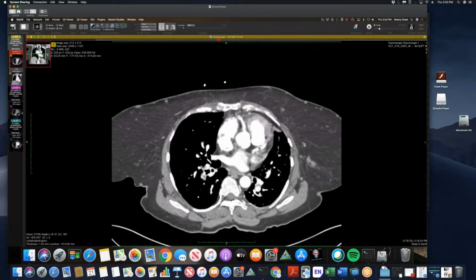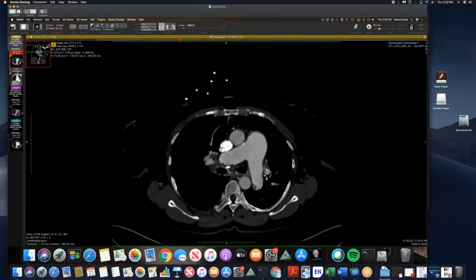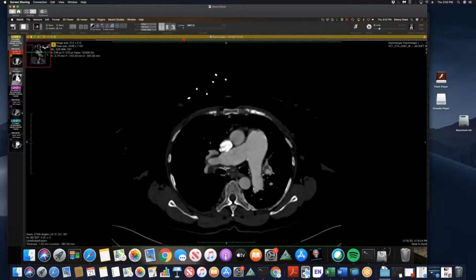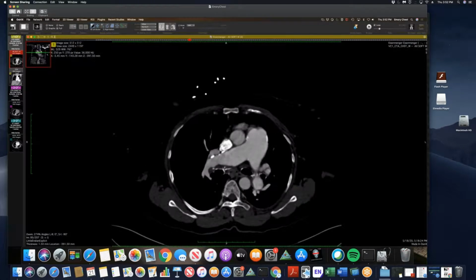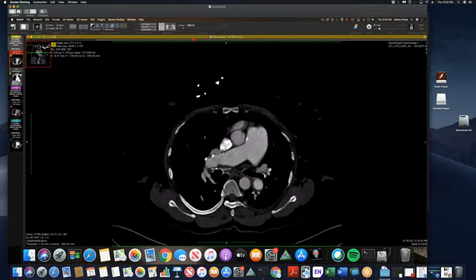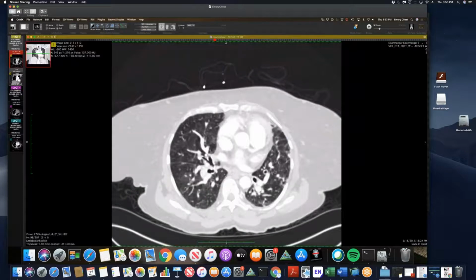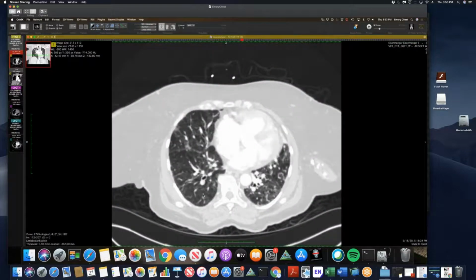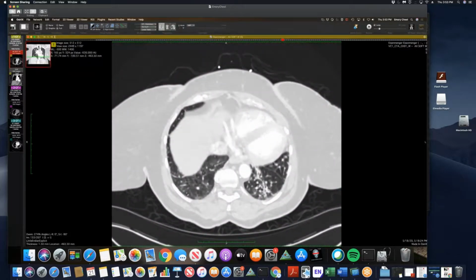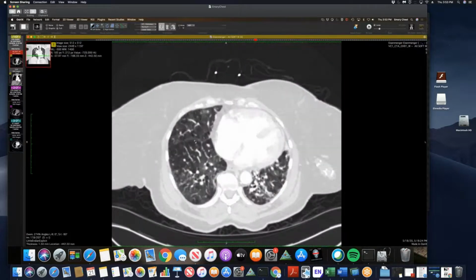If we go to the PA, she has filling defects. You can see atherosclerotic disease along the intima of the PA. This is in situ thrombus, most likely, which is commonly seen with Eisenmenger's. And if we go a little bit more peripherally, you can see these serpiginous vessels, which are pulmonary arteries or arterioles distally, almost continuous, almost running into the chest wall.